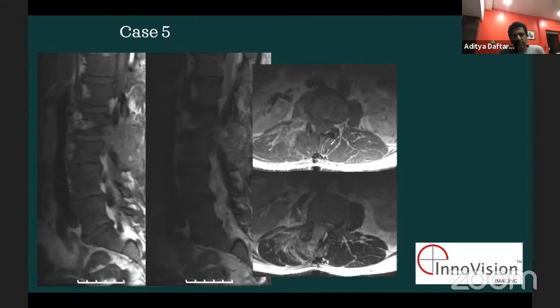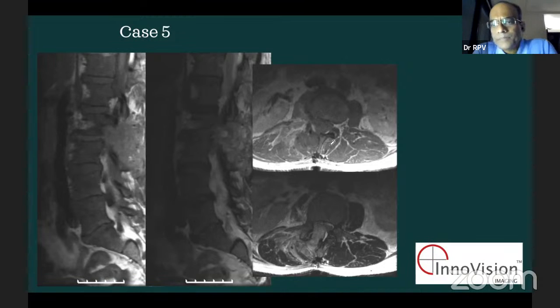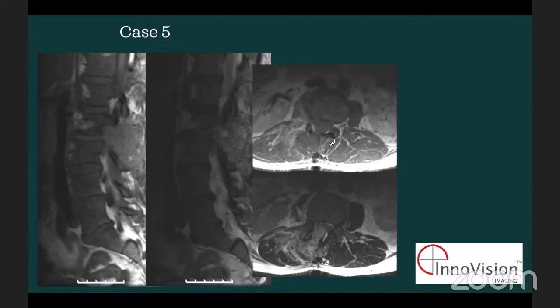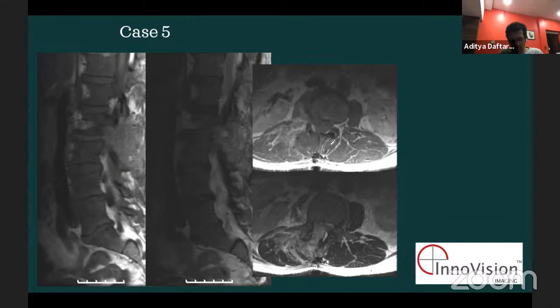Pus, you said, hematoma, you said. What else? One more thing you don't want to see, which is CSF. Sir, CSF collection. Yes, correct. So these three are the main three things that you're worried about when you are looking at immediate post-op. So when you look at this, what are you thinking about? Which of these three is more likely?